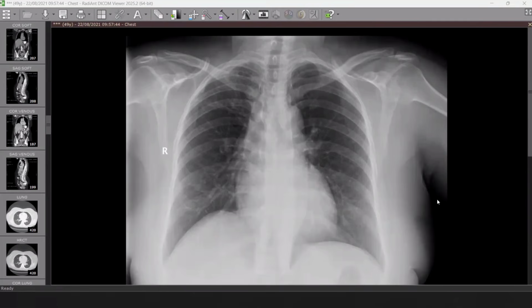So I've been provided with a frontal chest radiograph of a skeletally mature patient. On gross inspection, I can see that there are a few reticular opacities in the right upper lung zone. I do not see any cavitating lesion, any nodules, or any obvious consolidation. The lung volumes are largely preserved. The costophrenic angles are acute. I do not see any pneumothorax or any pneumoperitoneum.